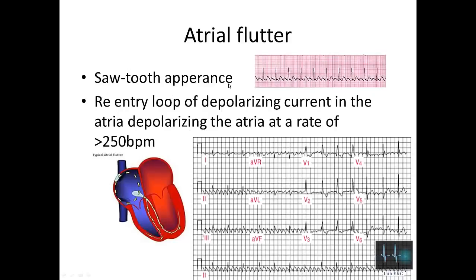The characteristic of atrial flutter is the sawtooth appearance. If you were to remove the QRS complexes, this would look like saw teeth, and is highly characteristic.